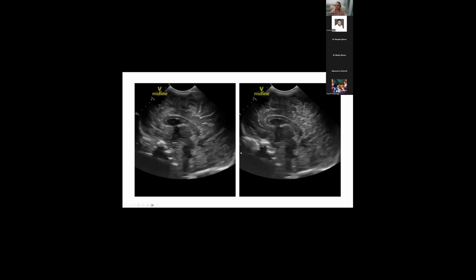So this is the midline view. What do we think? Anybody? Mid-sagittal view. Yeah. Good, bad? It's good. Yeah, it's decent. The resolution laterally is not good.